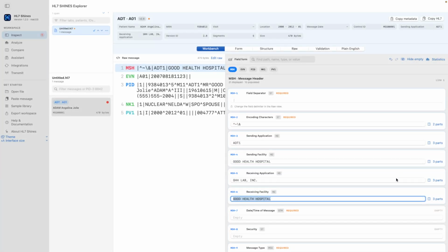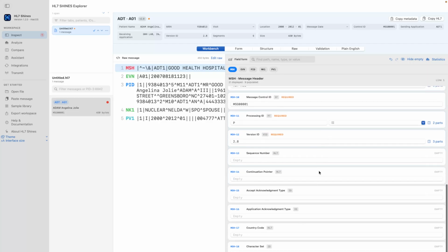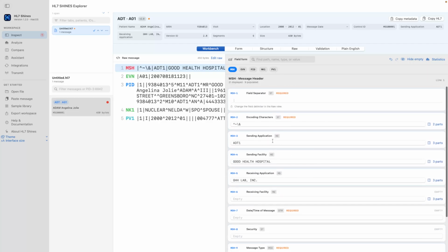So yeah, we missed a few things here. When I emptied the field, you can see I click hide, and it automatically hides these particular messages. For example, if I remove this MSH6 and click the tick mark, it automatically gets removed. If I want to show those empty fields, it will show them. So it doesn't waste our time. This is one of the options and it is so powerful.